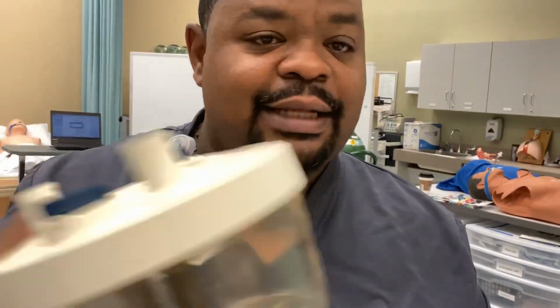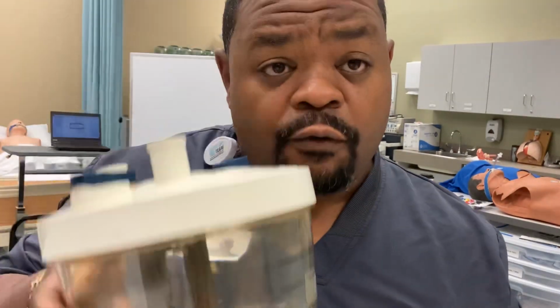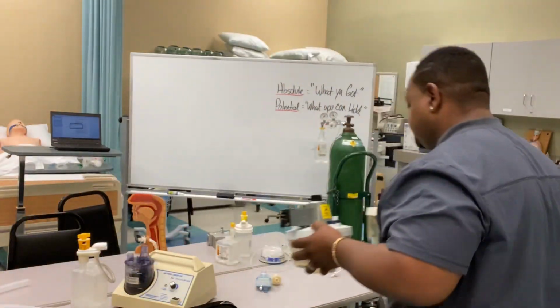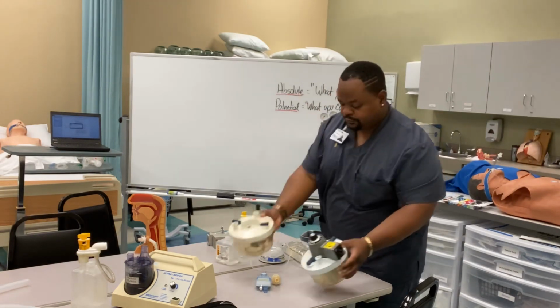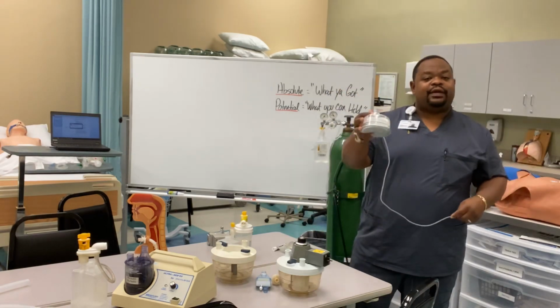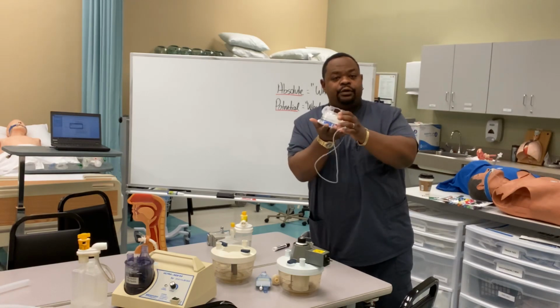With this one, not so much. It doesn't have a tower, okay? So the Passover humidifier is a cascade humidifier without a tower. Don't forget that. That's all it is. All right, so this is the cascade and this is the Passover. All right, this is another example of a cascade. This will be one that sits on top of a heater on your ventilator.